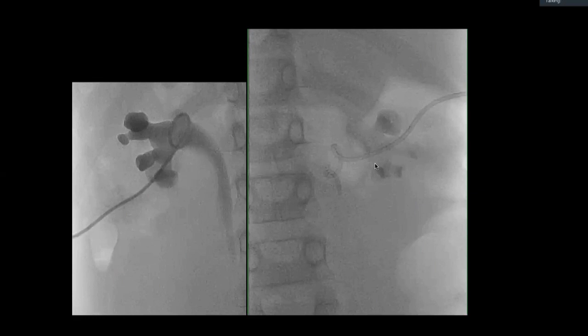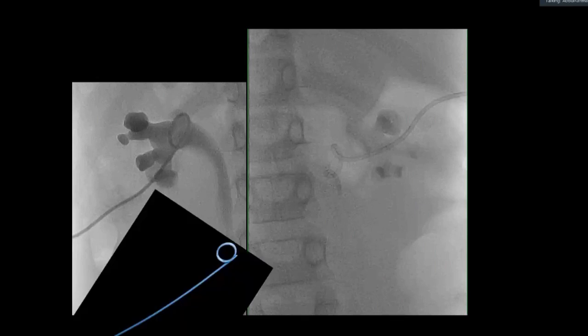So these are bilateral nephrostomies, okay? And obviously, yes, you gave all the findings correctly. You see contrast here, you can't see it. But obviously, you would ask for further views, right? Or further films. Yes. So this is not an IVU or anything like that. These are bilateral nephrostomy tubes. So not stents, bilateral nephrostomy tubes. And what are these? These are simply a pigtail catheter, like you would for your ascitic drain, like you would for your pleural drain. That's all it is. A nephrostomy is simply a pigtail catheter put into the pelvicalyceal system.